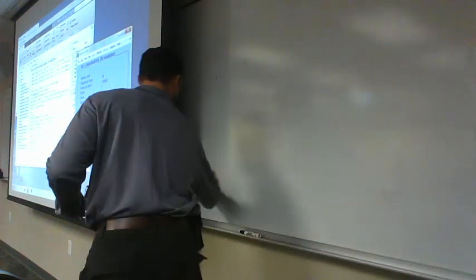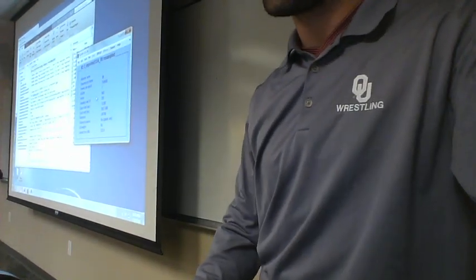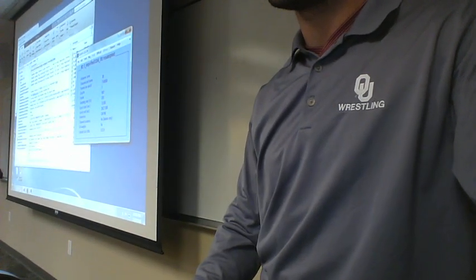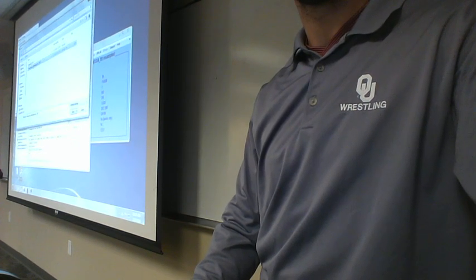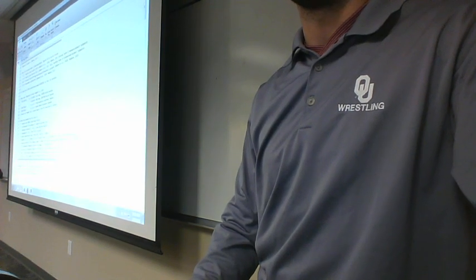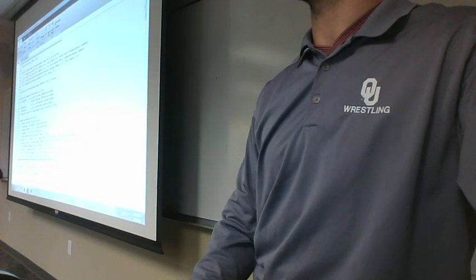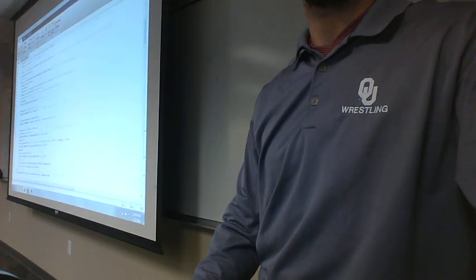So, actually, let me take a look here. Let me open something here. I'm opening the script that you have a copy of. You don't have to open it. This is a much more complicated script, but let's see here.